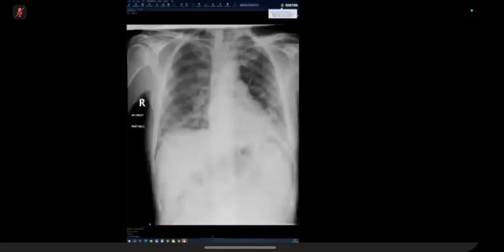Let's do one more. Have a go at this one. So the patient is a 78-year-old with increasing cough over the last 2 weeks. I am presented with a plain X-ray of a 72-year-old male with cough for the last few days.